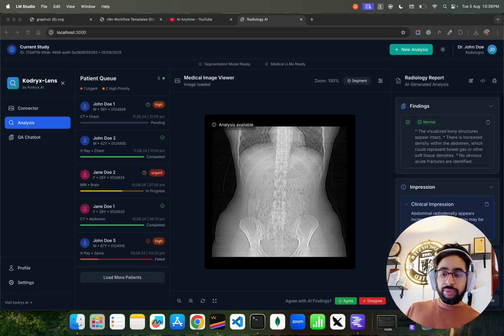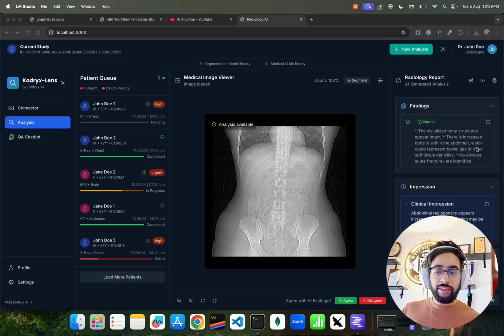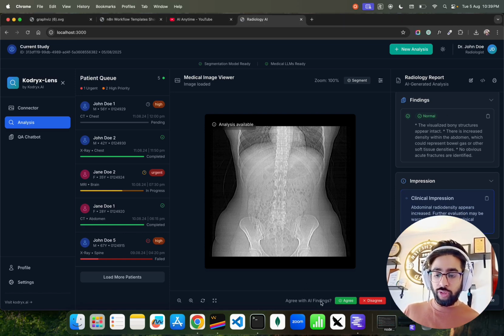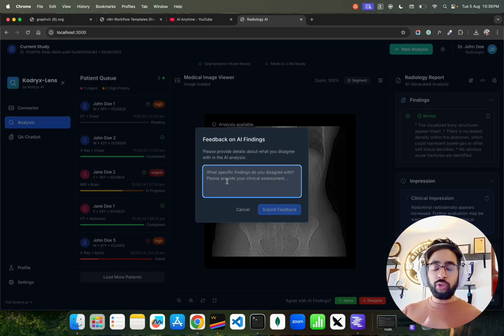Now, let's say the end user, who is a radiologist in this case, is not happy with this output. They can do a couple of things. One, they can agree with the AI findings. So you can see agree and disagree. Let's say if I click on disagree, they can put in their feedback.